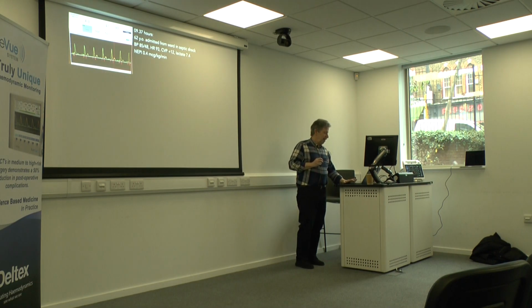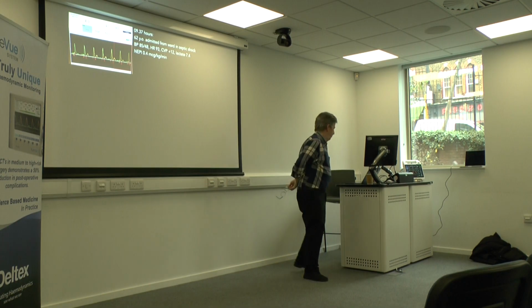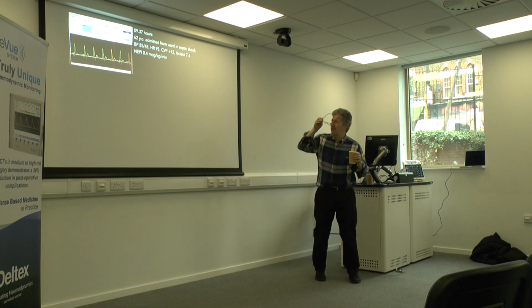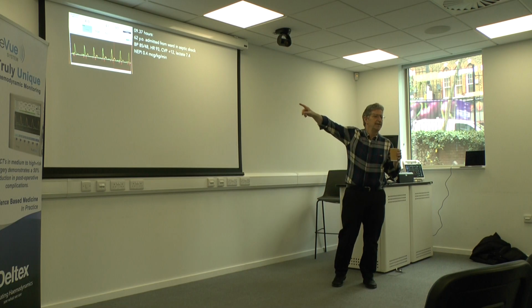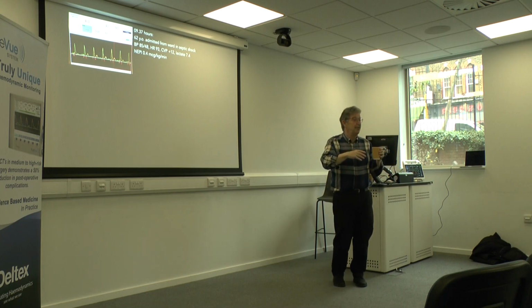Oh, sorry, let me go back. So again, looking at that waveform and the numbers, what do you think? Very narrow corrected flow time. Yeah, exactly. It's 160. It should be 330 to 360, around 350.